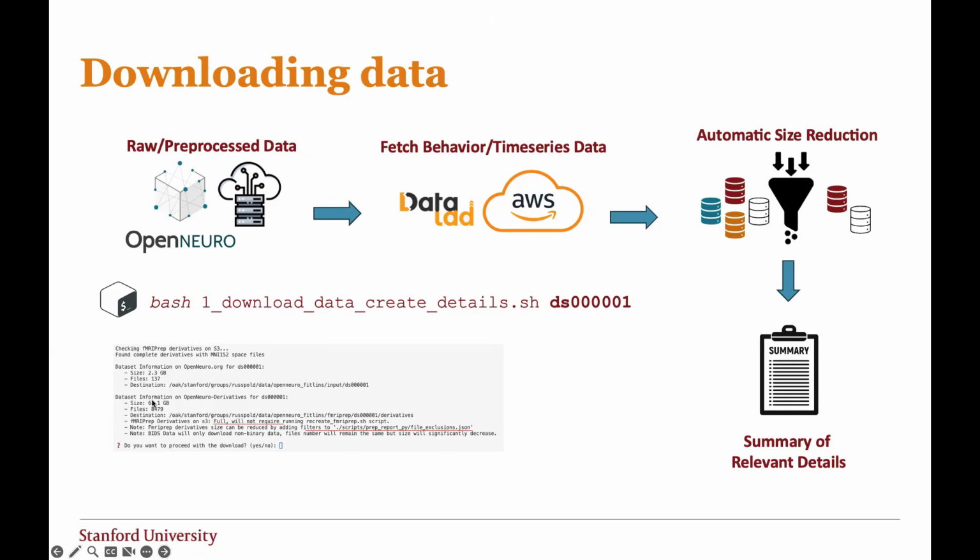And so it gives you these file counts and sizes, and if you want to reduce the amount you're getting, say if you want to run 20 studies, you can leverage the file exclusion folder so that you downsize. But once you're ready, you just run it. It throws a bunch of things in the terminal, like what it's pulling down, so you can ignore those. But at the end, it gives you some information on the task, and other details about the subjects.